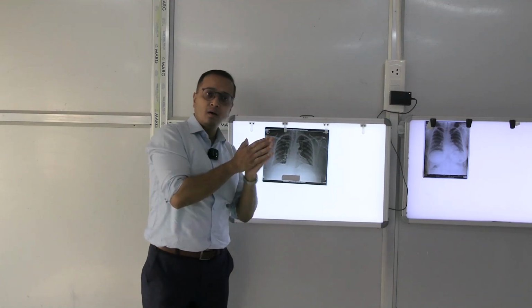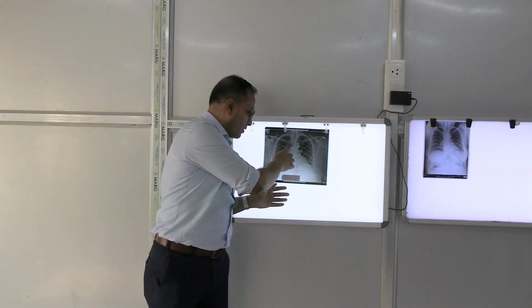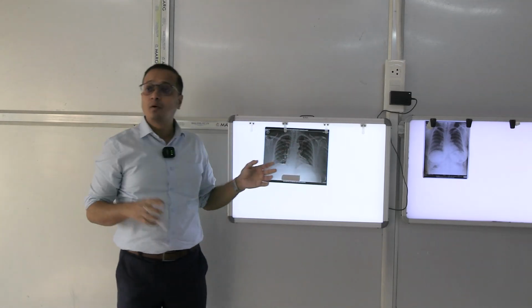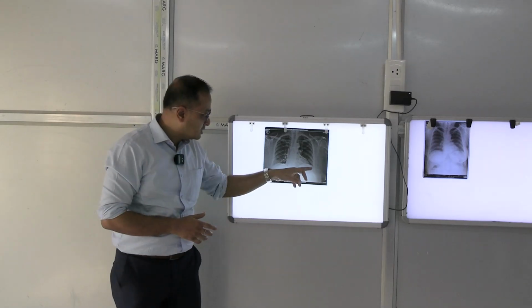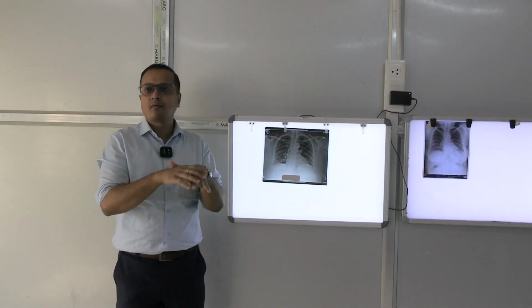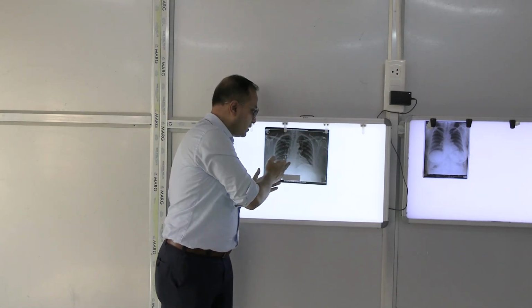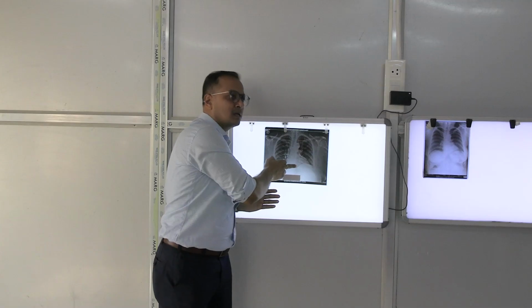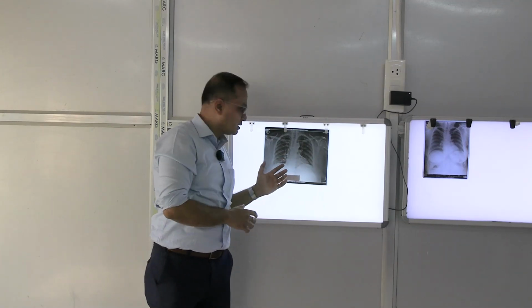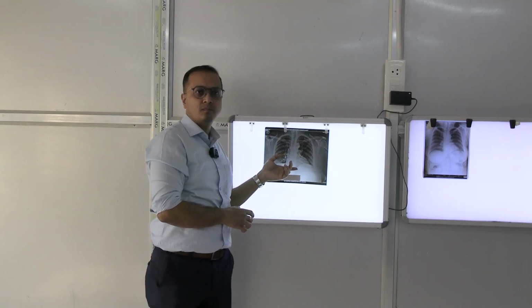So radiologically, you should be able to identify the right border of the heart and the left border of the heart. These two borders, along with this inferior border, which will be roughly like this, sit on the middle portion of the diaphragm. The diaphragm has two domes, two elevations. In between we have this region, which we call the central tendon. On the central tendon, the inferior border of the heart is present. So this region is formed by the inferior border of the heart.